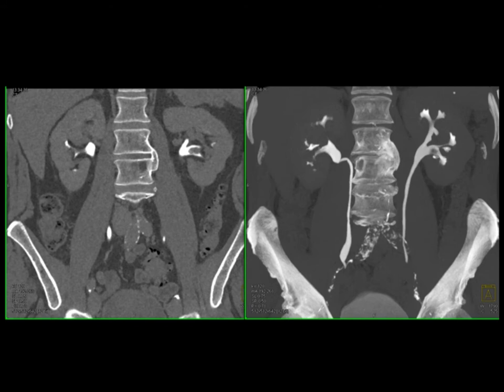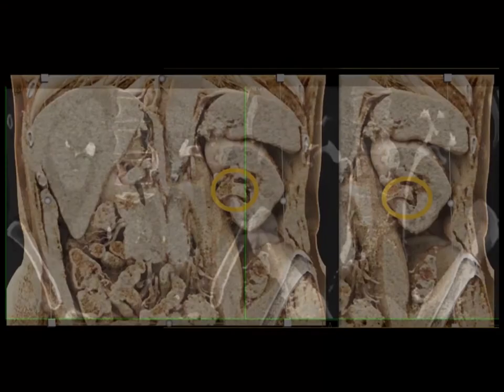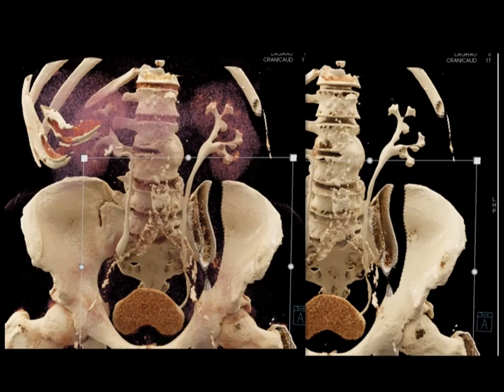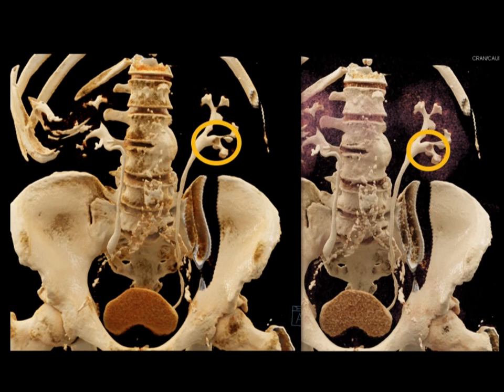Transitional cell carcinoma, lower pole calyces, which you also can see with cinematic rendering. So I'm showing it to you 10 different ways, but I do want to emphasize how easy it is to miss. And here's when I pull out the calyces on the cinematic rendering, and look how nicely you see that filling defect in the left renal pelvis. So again, we have a new way of looking at things, but if you don't look carefully, if you don't do the protocols correctly, you're not going to be successful in that regard.